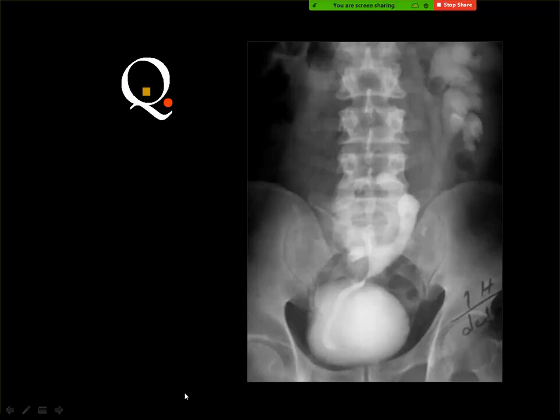Pelvic right kidney. Yes, ectopic kidney. No, ectopic right kidney, the pelvic right kidney is pelvic and ectopic. Anything else? And any left kidney complication? More rotated? Yes. Any other crossed pathology? Complication of the left kidney: duplication of the left kidney with hydronephrosis. Do you see the cause?